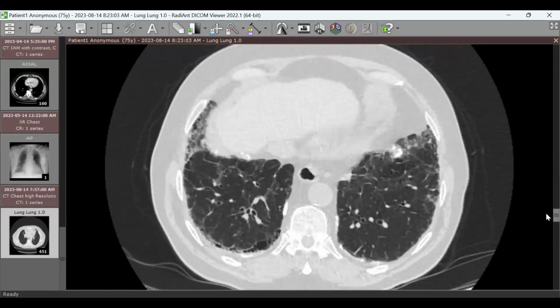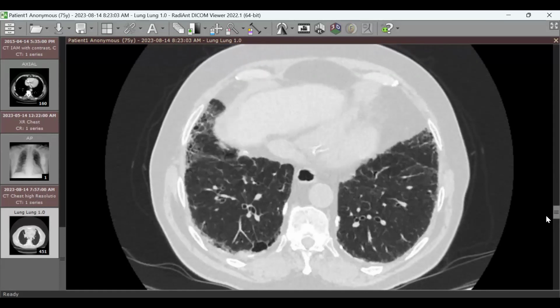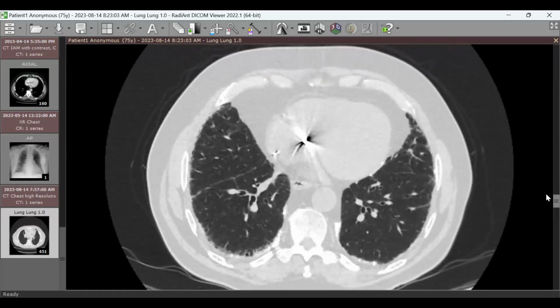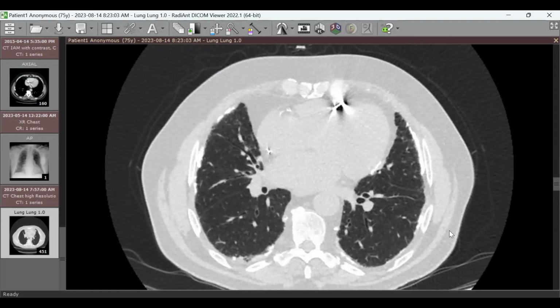The final diagnosis, is it idiopathic pulmonary fibrosis or a secondary cause? I don't think it is idiopathic. It has a cardiac disease, as we said. No, I mean you have an ILD pattern typical of UIP, and we have asbestos exposure.